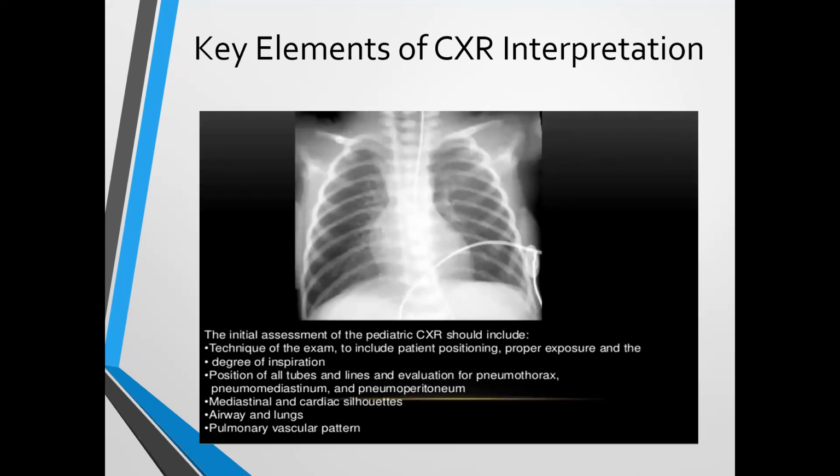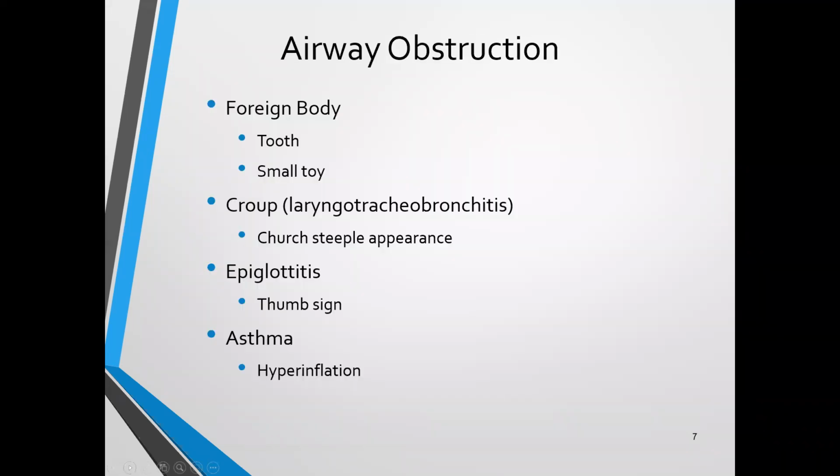So in some patients that are fluid overloaded, even in this patient population, you'll see some vascularity there that you normally wouldn't see, because the vessels can become engorged. So we'll see some of this as we proceed through this presentation.